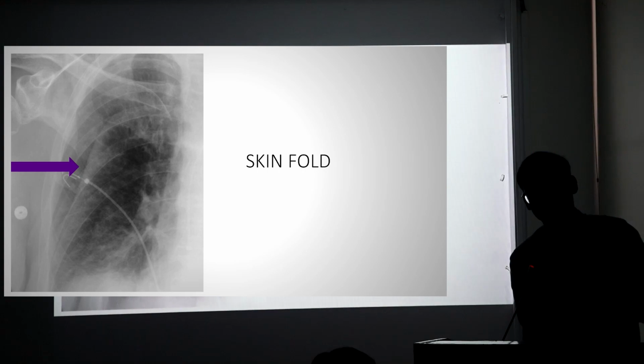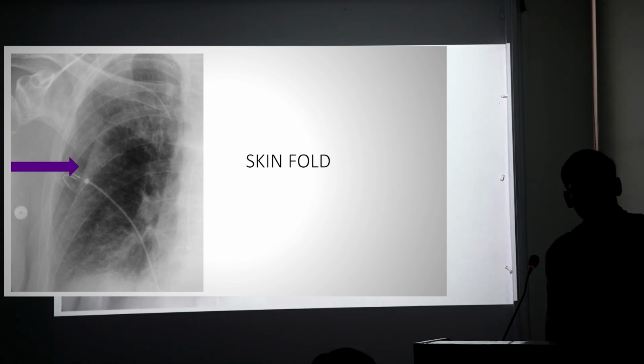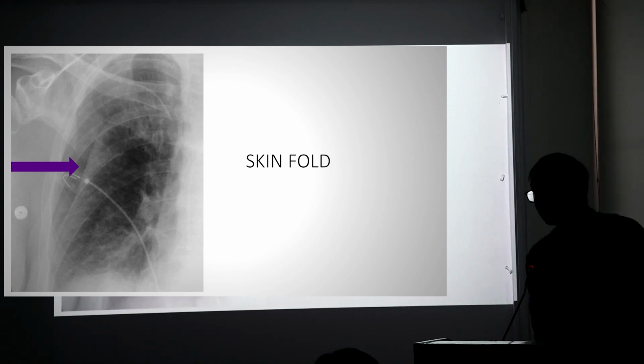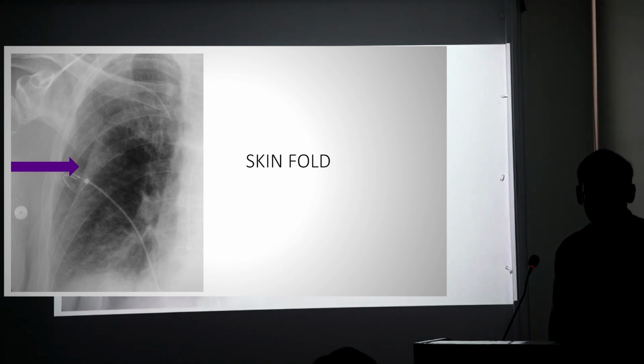What is this? Would you like to give a chest drain over here? Is this a pneumothorax? This is the problem with the portable X-rays we get sometimes in our ICU. So this is a skin fold. We have to look beyond the margin which we get. This is going to be a catastrophe if you put a chest drain over here.